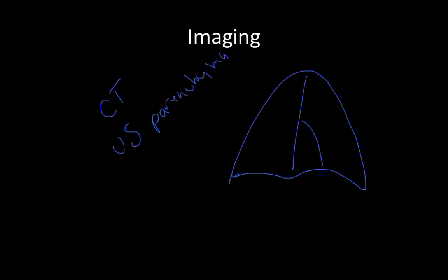But in looking at a chest x-ray, things that you want to look for are not just extra shadows. It's actually loss of what you expect to see there. For example, loss of the heart border, loss of the diaphragm, loss of the costophrenic angle, and also the pattern of the infiltrate. If you have a system in reading a chest x-ray, you're going to look for the border of the heart, the diaphragm, and the costophrenic angles.